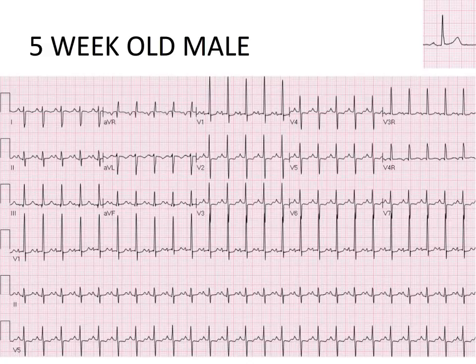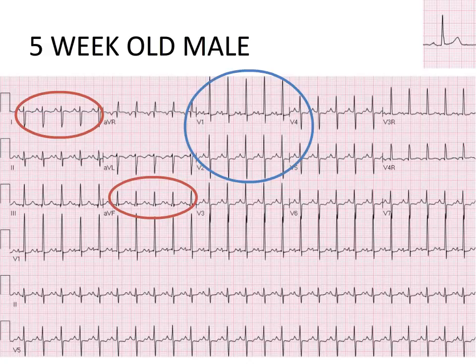Go through this EKG on your own and type any abnormalities in the box. When you are done, hit the submit button. You should have found that the abnormalities on this EKG are right ventricular hypertrophy and right axis deviation. The right axis deviation is diagnosed because the QRS complexes are down in 1 and up in AVF. You can also see the strong rightward forces in V1 and V2, as well as an upright T wave in V1, which is consistent with RVH.